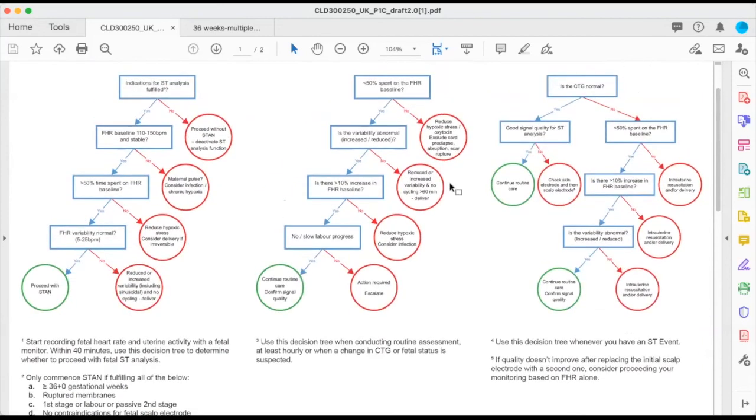If it is because of hypoxia, then I need to make sure that this baby is fine, that this baby gets happier. So I will need to improve baby's situation as soon as I can. So if she's contracting too frequently, I'm going to space the contractions out. If the baby has started showing signs that it's redistributing, I'm going to try and reverse that. I can reduce the contractions or potentially give her a tocolytic to make things better. Okay. If the baby is reaching the point that we are decompensating and brain ischemia, then I definitely need to deliver the baby.